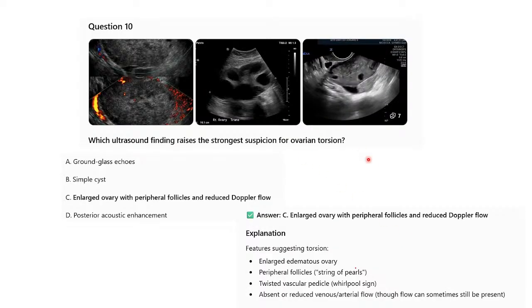So this is the last and final question: which one of the findings raises a strong suspicion for ovarian torsion?